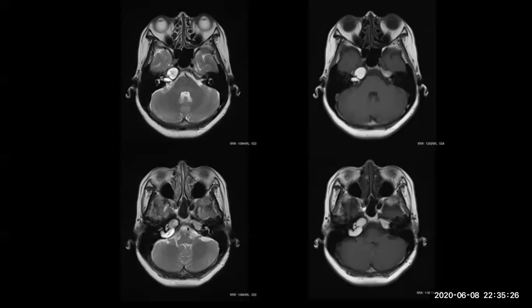Metastasis? I know that metastasis is mostly hypo in T1 and upper in T2. Okay, if it is hyper in T1 and T2, you mean melanoma metastasis? Melanoma, okay, but in melanoma it is an enhancing tumor. Yes, and mostly it is hypo in T2.